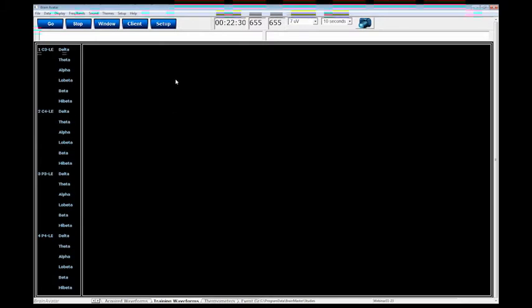There are two different bits of information. You've got your acquisition data, which is all your different bands that you're acquiring in. And then your training data is your training channels that you're used to, which is up to 4 channels that you have in the Discovery software.